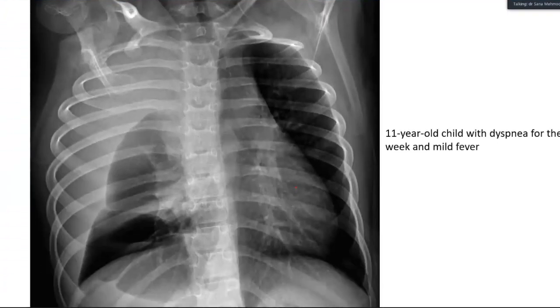Sir, I'm presented with an X-ray chest frontal projection of a skeletally immature patient. On the given X-ray, there appears to be mediastinal and tracheal shift towards the left side, and there appears to be radio-opaque haziness projected over the lateral part of the right hemithorax with reduced lung volume on the right side.